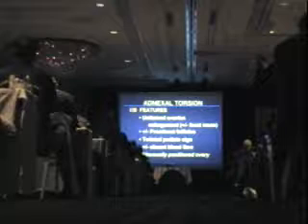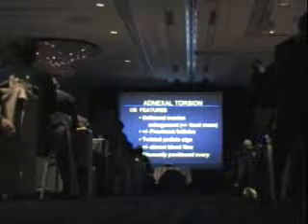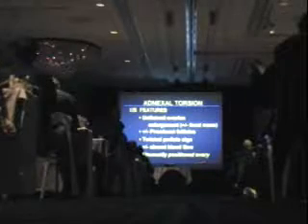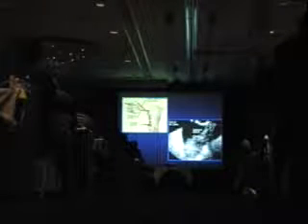One of the things I think that should be emphasized is that you may have blood flow because of a dual blood supply to the ovary, and I really emphasize the unusual location of these ovaries. Here we can see from this diagram how the ovary does have a blood supply coming in from medial and lateral. So if you torse one portion of this, you may preserve flow to the ovary.